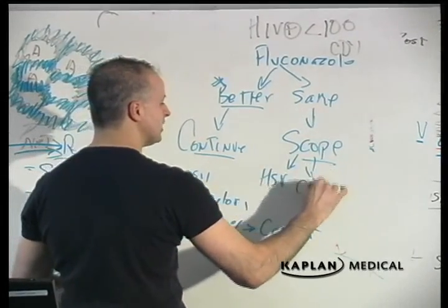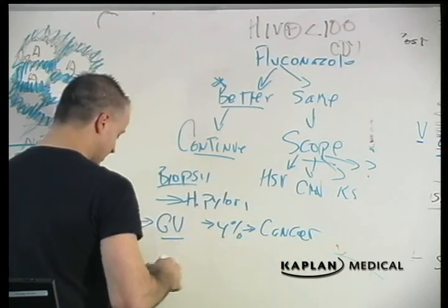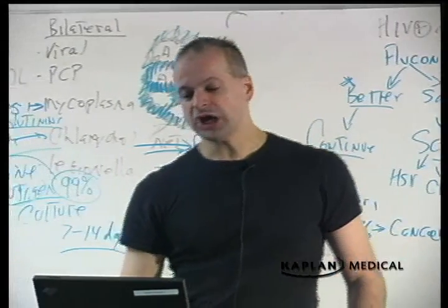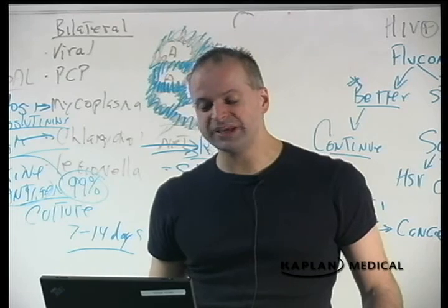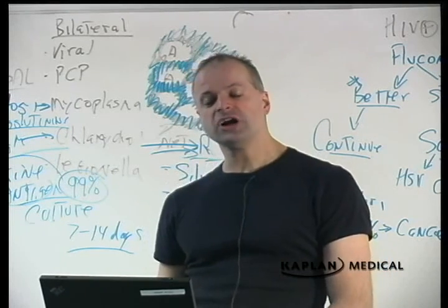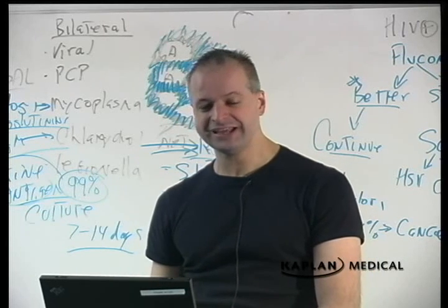Maybe it's CMV. Maybe it's Kaposi sarcoma. Maybe it's idiopathic. Maybe it's an aphthous ulcer. So therefore, the most accurate test is upper endoscopy. Upper endoscopy is the most accurate test to look at the esophagus. So therefore, the radiologic test is not the most accurate because this is the appearance of Candida going up and down the esophagus.